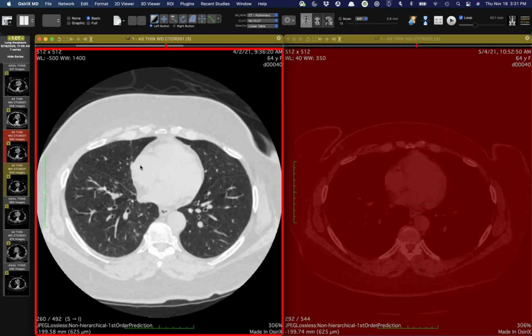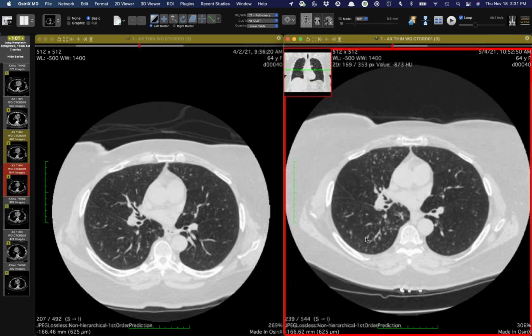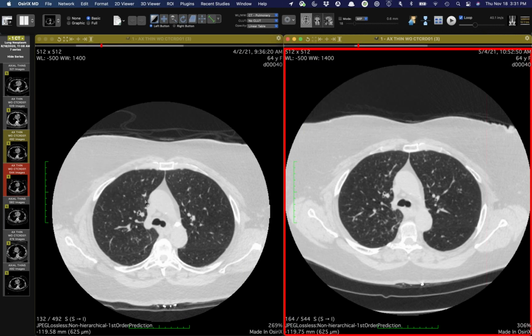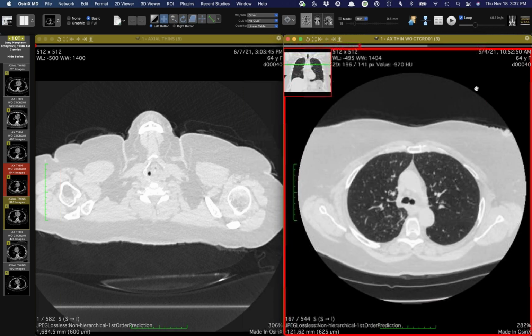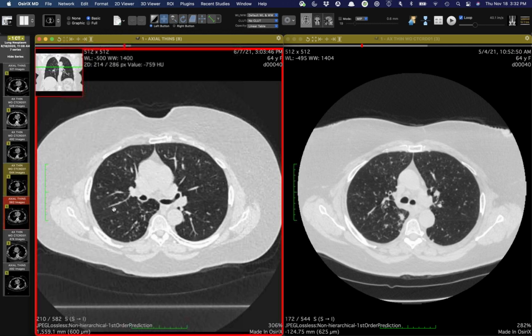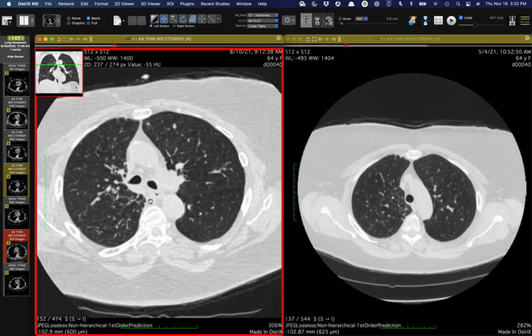Trying to get both of these up side by side. Fast forward to May, things are getting a little bit bigger. This may have been the time of the bronch, since the nodules are increasing in size and number. Certainly a little bit worrisome. I'm going to have to stop the syncing here. This is May, this is June, still there, not too much change. They're very solid, again studying the fissures and whatnot. Then this is the one where they continue to get a little bit worse.